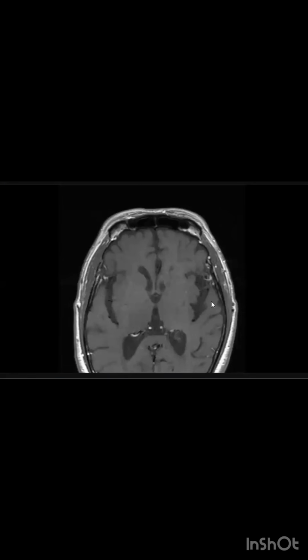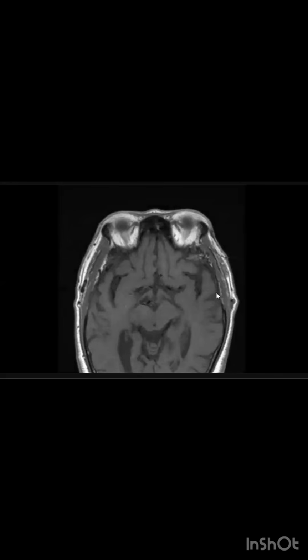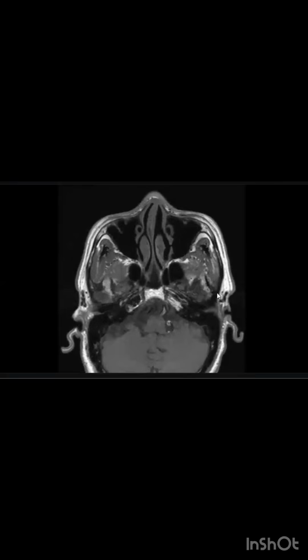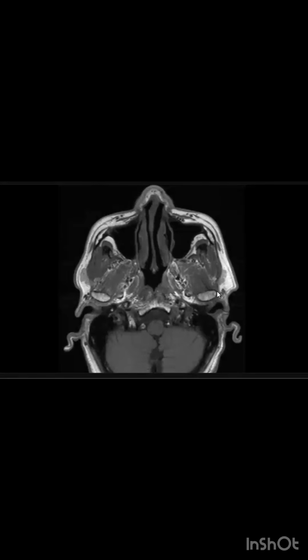Your patient is an 80-year-old male with right hemifacial numbness. You can scroll. Okay, so I've been presented with an 80-year-old male patient with hemifacial numbness. I'm just scrolling the images. I'll take a moment to scroll through the images before I start describing my findings. The patient had right-sided hemifacial numbness.